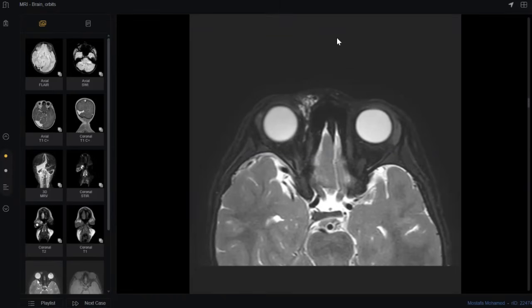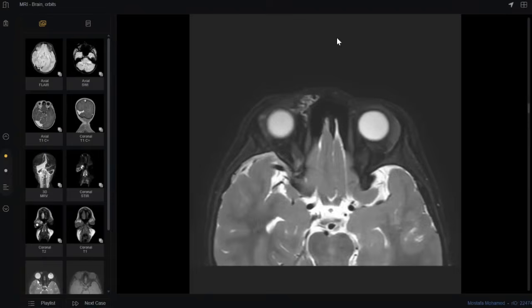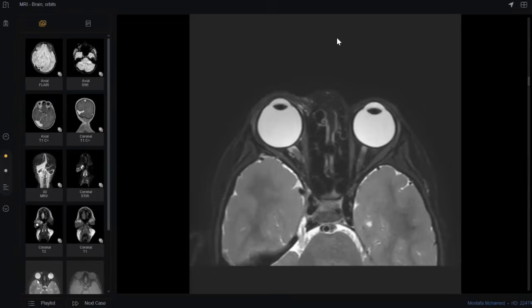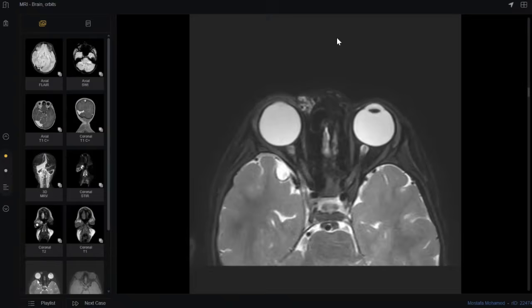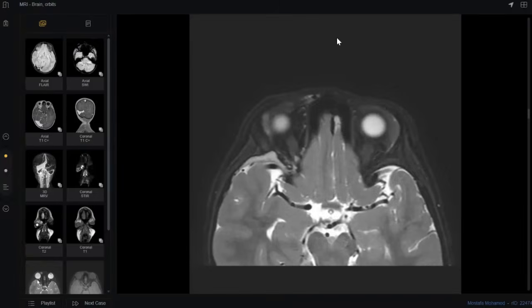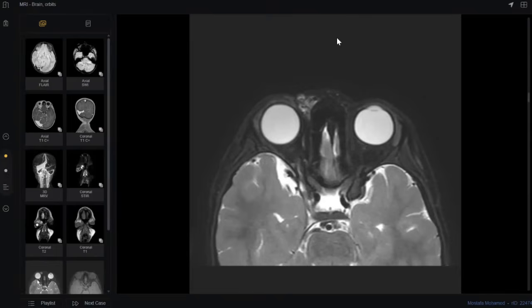What's your abnormal diagnosis? Dilated vessel. What's your diagnosis? Abnormal communication, maybe some dural venous sinus. Abnormal communication between vessels. What does it mean? Vascular malformation. Yes, vascular malformation. Okay. Thank you, doctor. What happened here, my colleague?